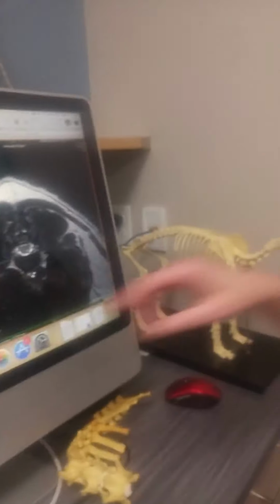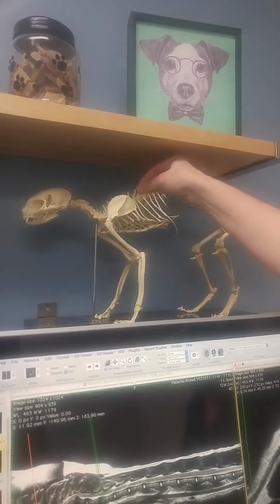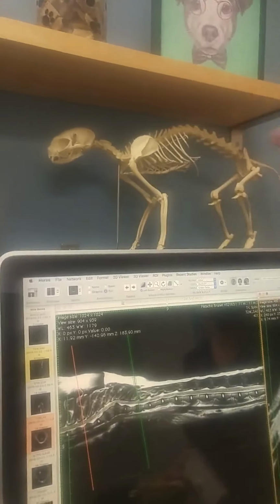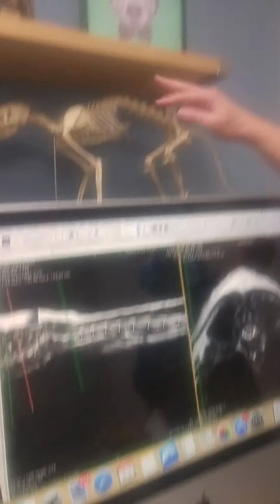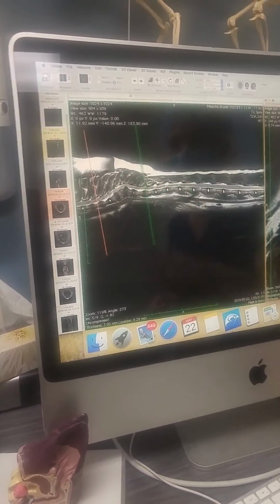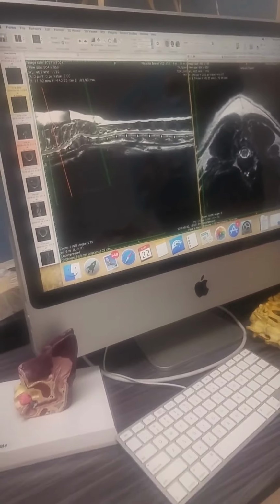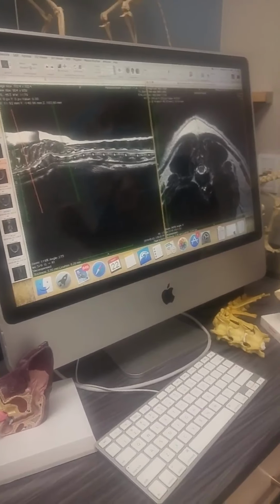Yeah, exactly. So that is right around here, really, and that's where he was kind of wiggly looking. And again, this spot explains perfectly why those back legs, the signal is not perfect. Okay, so now that we see that, and because we have abnormally shaped bone, what can cause abnormally shaped bone? Well, in a young animal, we always think about malformation. He was just made like that. He was the runt too.